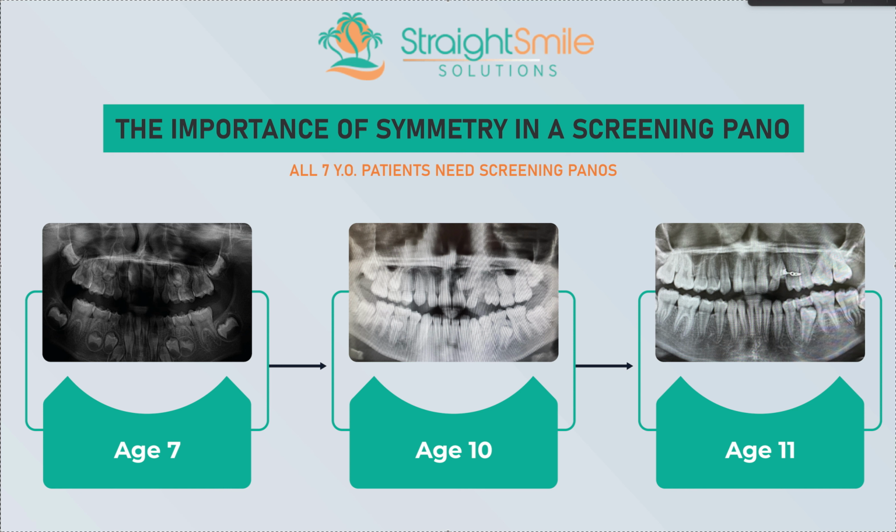But now I'm going to specifically not just talk about why you take a pano. That's obvious. I have tons of content on that, and you guys know about that. I'm going to talk about symmetry. And this is a patient of mine, and I apologize, some of the quality is not the best. But you never know at the time that you're going to be making content on it. But just an example, hopefully you can see what I'm seeing.